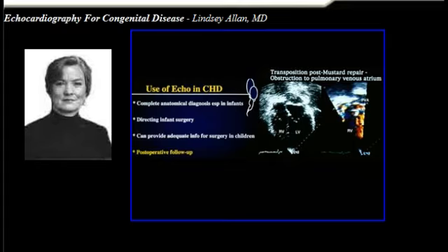Now, what about post-operative follow-up? Of course, once the surgeon's been in there, the anatomy is rather distorted. It's rather different from what you expect. It takes a little while to learn how different surgical techniques look. But here's an example of the use of post-operative follow-up.